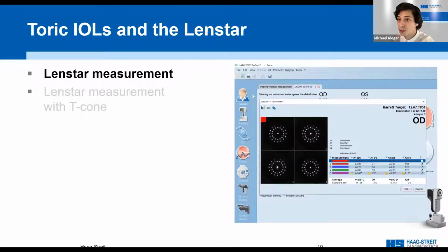The dual zone reflective keratometry readings consist of 2 rings with 16 markers each and provide information about the corneal curvature, which holds information about astigmatism and the axis. This dense point pattern consists of 32 points, and they allow for high precision readings.